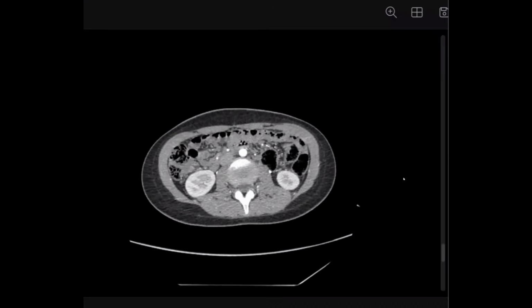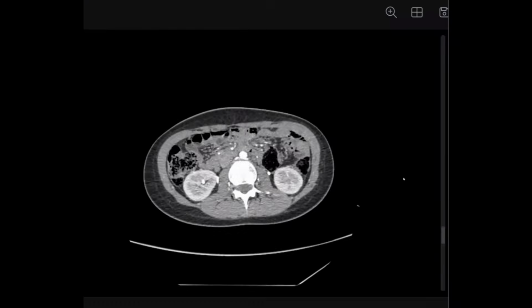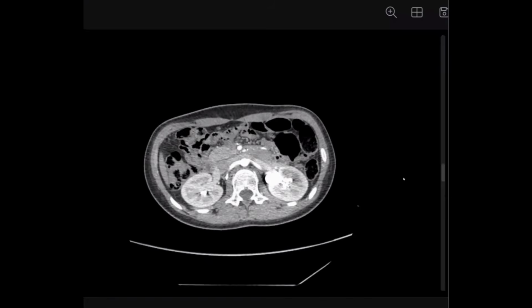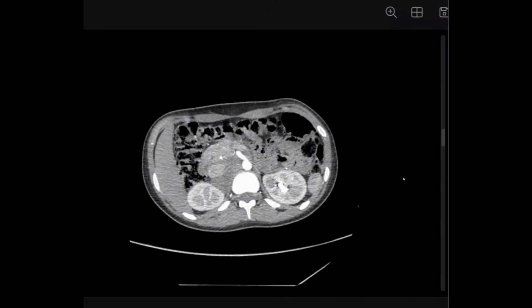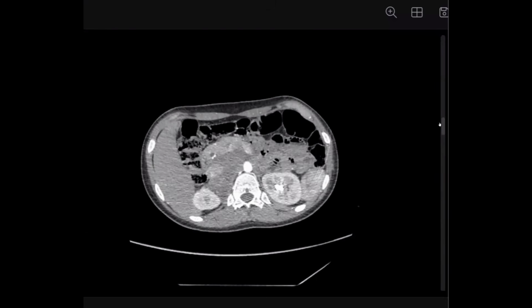While going downward, I can see that this thickening is now extending towards the midline while staying anterior to the aorta and displacing the vessels. This mass is centralized on the central portion of the retroperitoneal structures between the aorta and IVC, the aortocaval space and also the retrocaval space, encircling the IVC without obstruction and displacing the pancreas anteriorly. It shows some flakes of calcifications. Very nice. Is the mass enhancing or not enhancing?